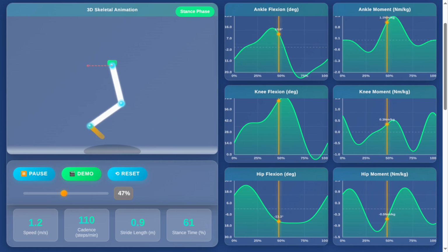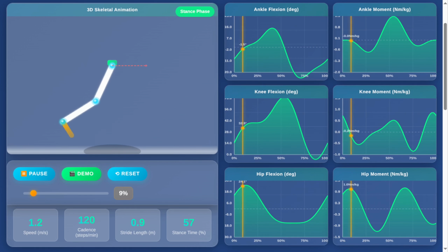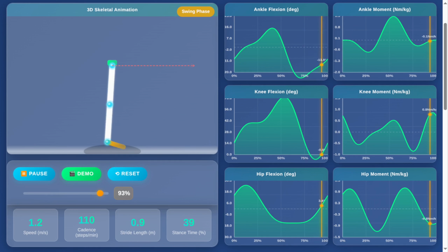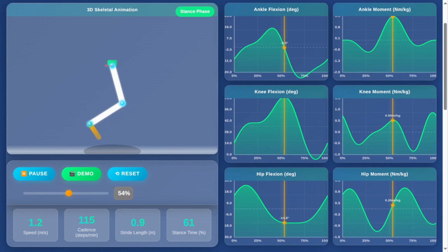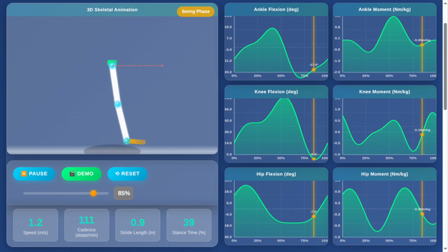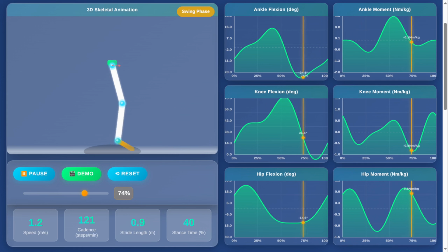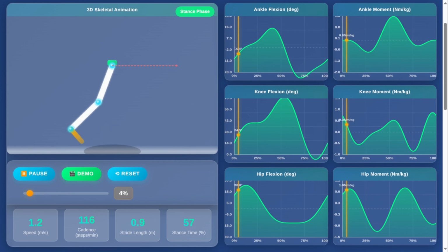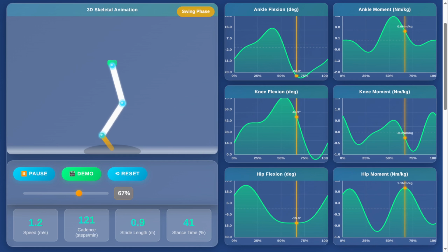No other funny comments come to mind at the moment. Do you have any further questions about the application or gait analysis? The prompt engineer was almost 1 gigabyte in the browser memory. I guess it's all the video. But then the video should not be stored, it should be just converted into tokens or something. I don't know how it works.